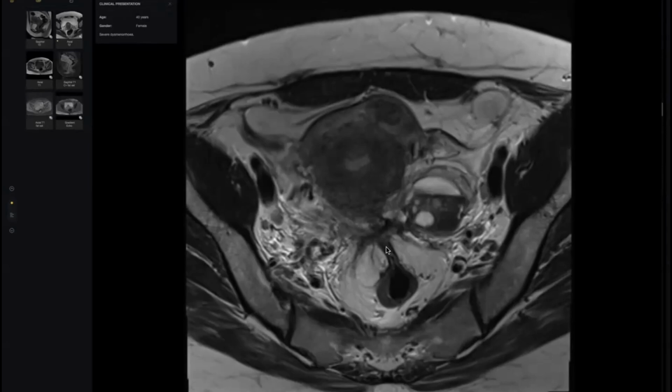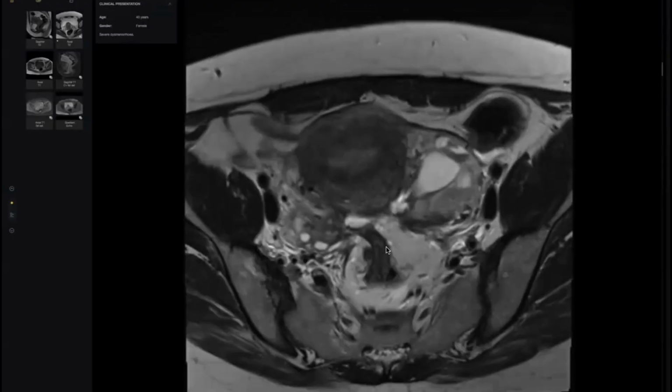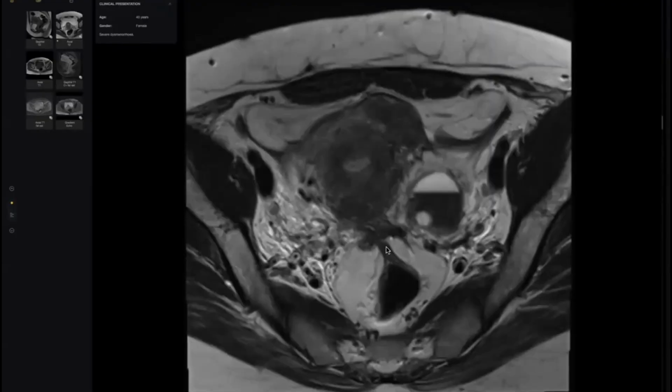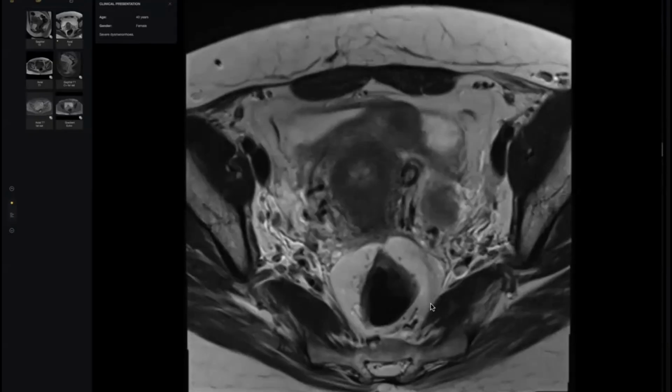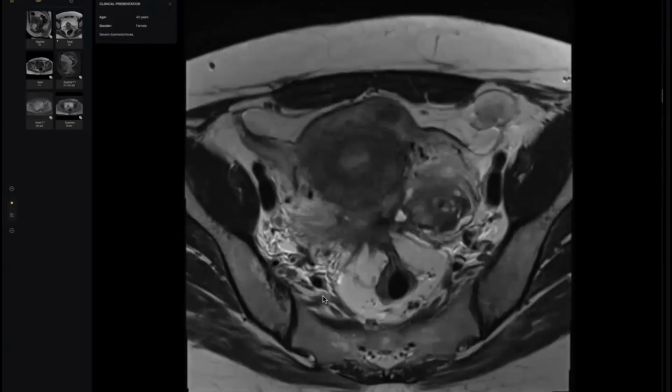Okay, the deep pelvic endometriosis takes one of two signs: either high T1 implantation. Where is the most common site of implantation of this endometrioma, in this ligament? Uterosacral ligament. This one, this is the uterosacral. But here the ligament is very smooth, very thin. There is a cutoff point. This ligament maximally measures 5 mm. But when it has become nodular, or high T1 signal, or more than 9 mm, you should suspect deep pelvic endometriosis. This is the common site. Second, this fibrosis.